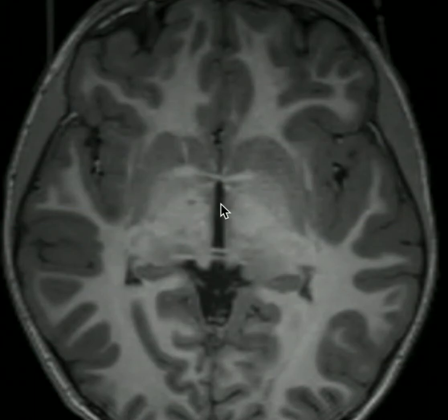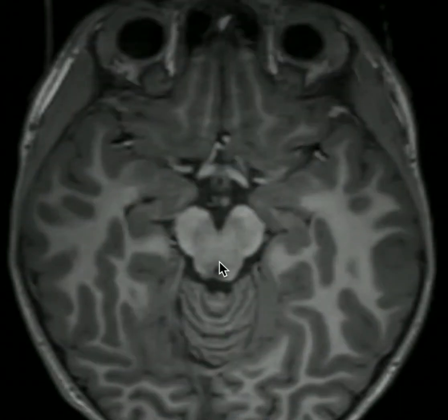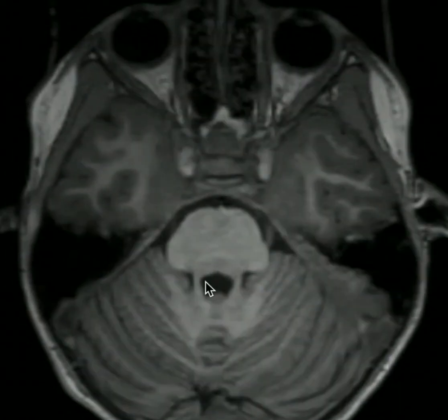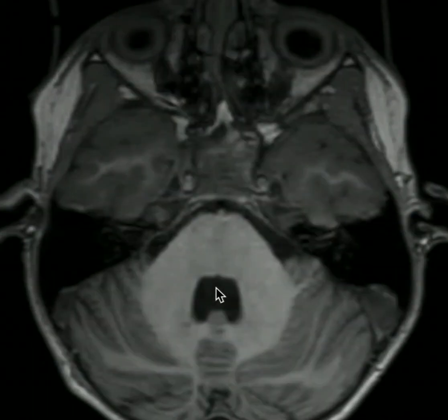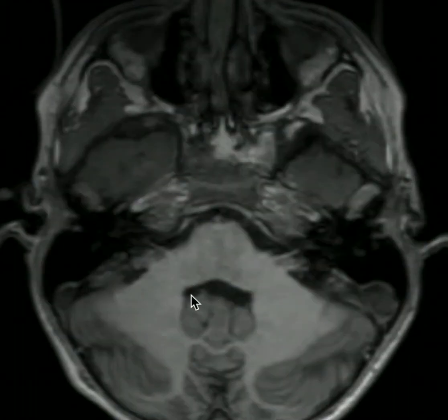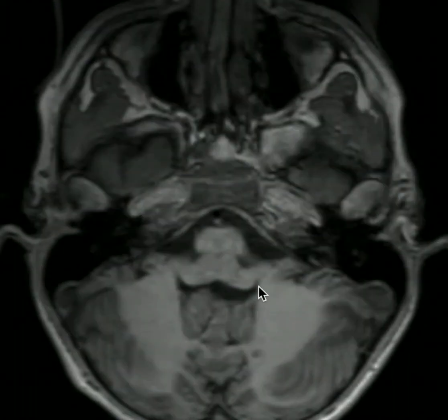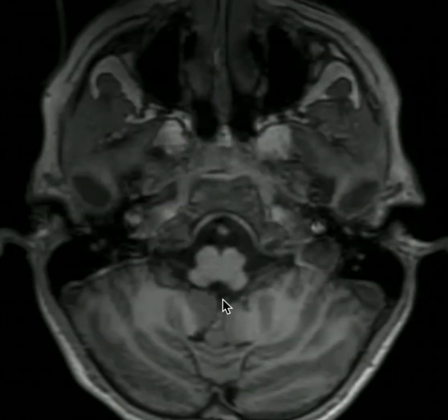We'll follow this further inferiorly now until we reach the cerebral aqueduct, which comes off of it posteriorly here, which will feed down into our fourth ventricle, seen way down here. The fourth ventricle will have openings laterally, known as the lateral foramina of Luschka. They're seen here on the right and here on the left. And if I go further inferiorly now, we'll see our central foramen of Magendie, or median aperture, right here.